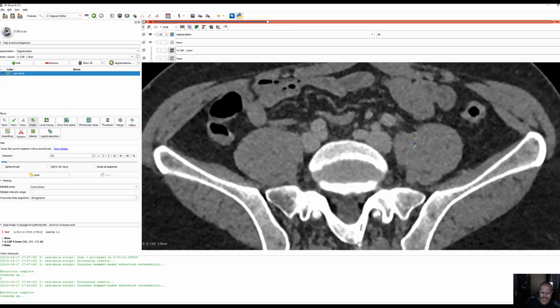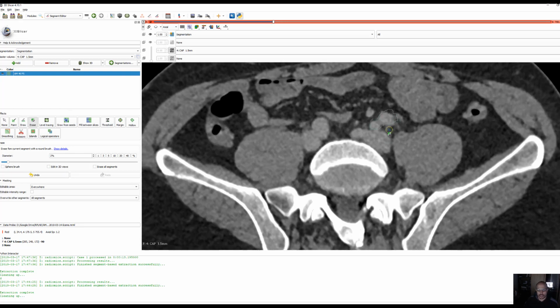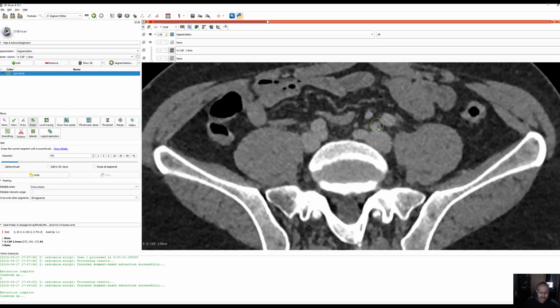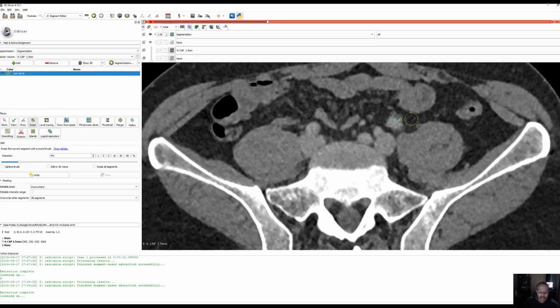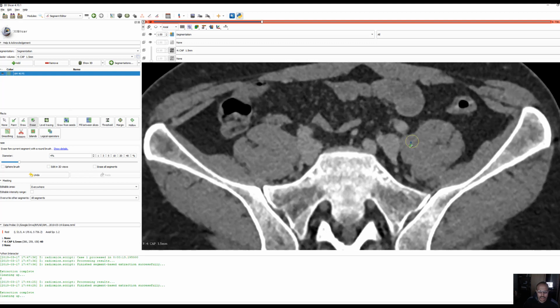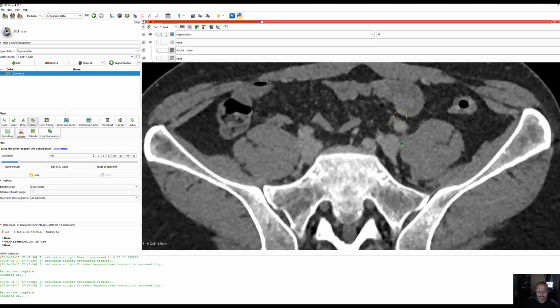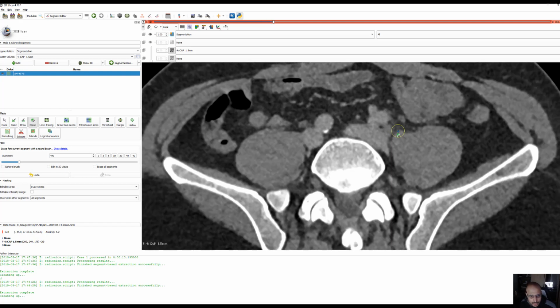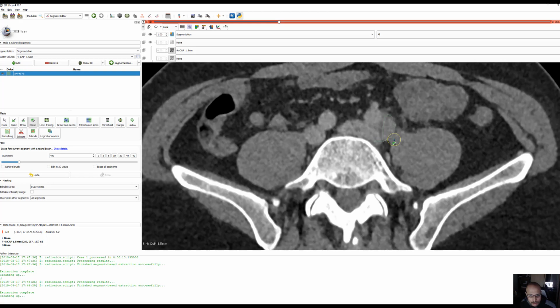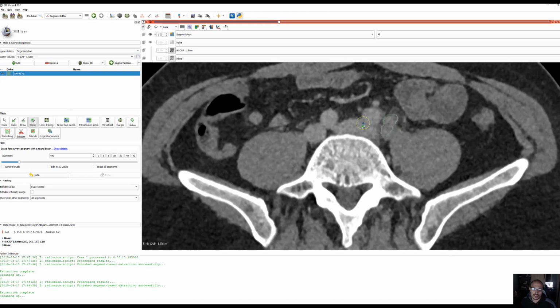Yeah, so I see that those are vessels. And you've got those in some of that, so you don't want any of that. So I'm just going to increase the size of this. Can't have any extra voxel. That will be a disaster. All connected voxels, no disconnected voxel. So I think that is all an artery here.